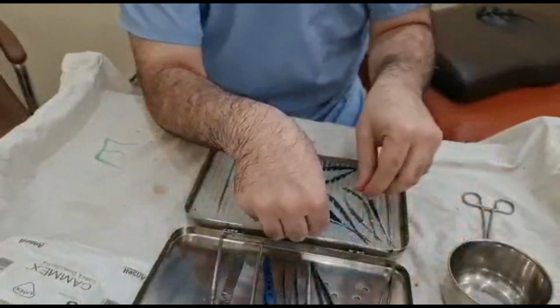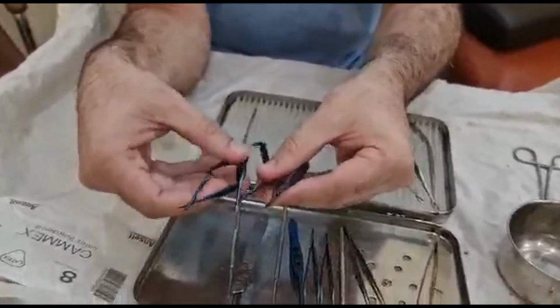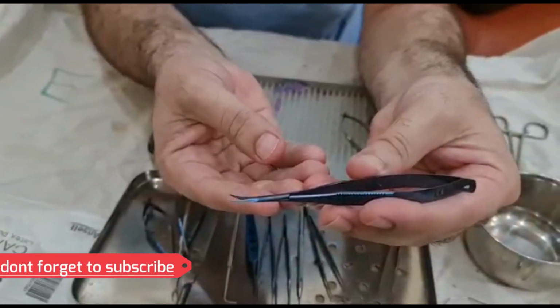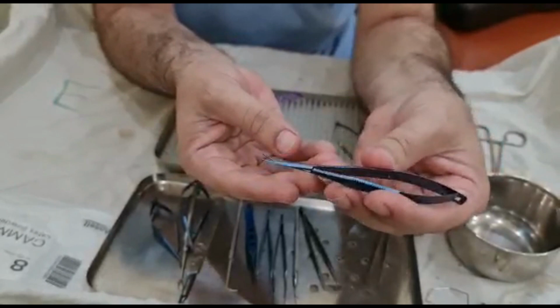We have some scissors, smaller, medium, and larger. The larger one we use for bigger surgeries like dacryocystorhinostomy, eyelid surgery, skin, tenon capsule cutting or muscle cutting.